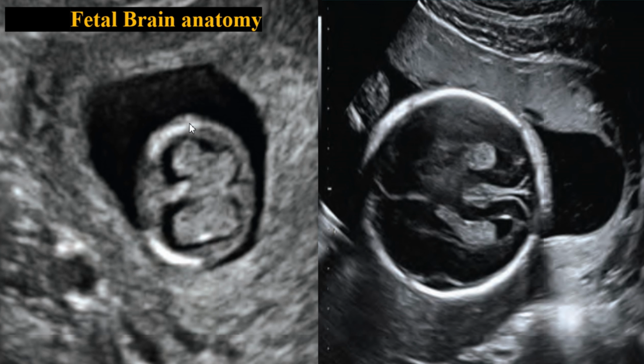And this axial image of the head at the level of the lateral ventricles demonstrates a bilateral choroid plexus, which is seen here, filling the lateral ventricles, and it is a normal variation in filling the atrium of the lateral ventricle by the choroid plexus. And here we can see the choroid plexus fills the entire width of the lateral ventricles, abutting both the anterior and the medial ventricle wall.